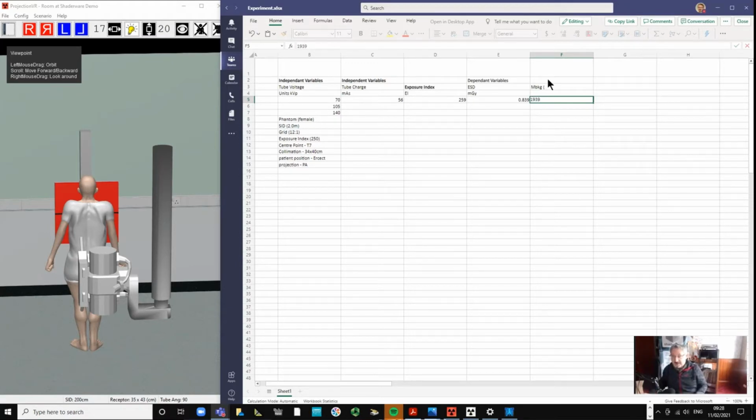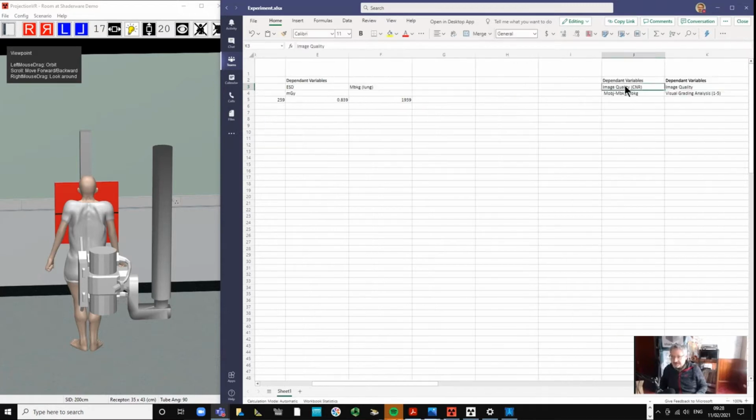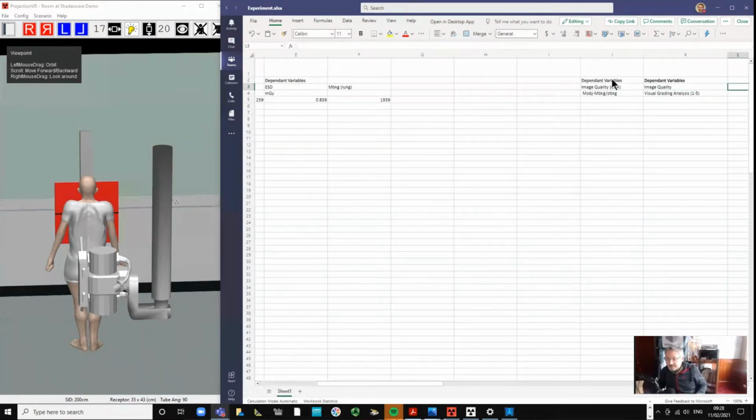Perfect. Now, what do we call the background? Which was the background? That was the lung, wasn't it? Yeah. And then we've got mean pixel value obj. Oh, actually, we need standard deviation, don't we? So remember all the trouble we had with that symbol. We'll copy that rather than go through all that trouble again.